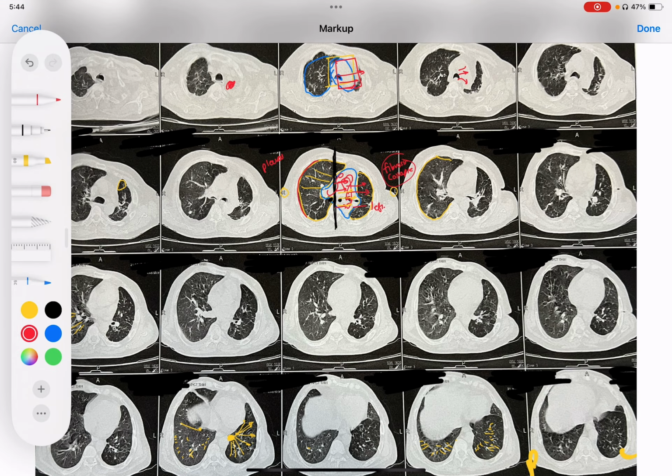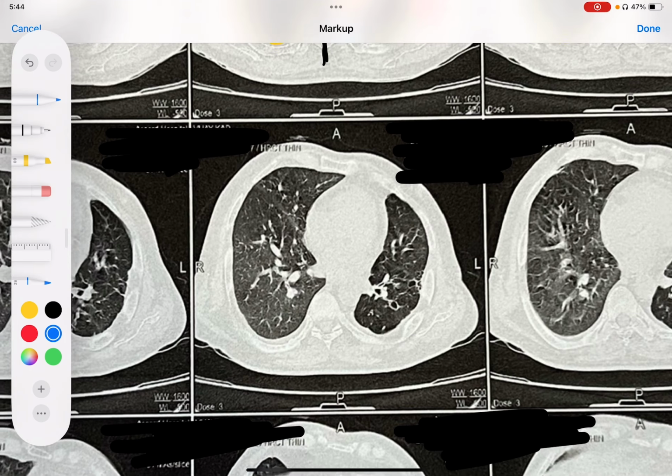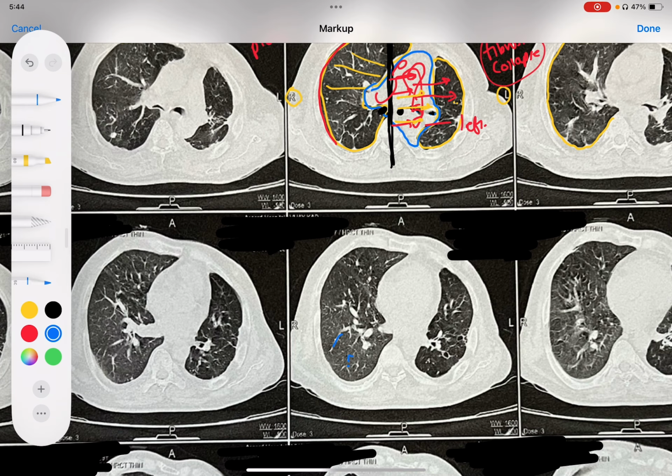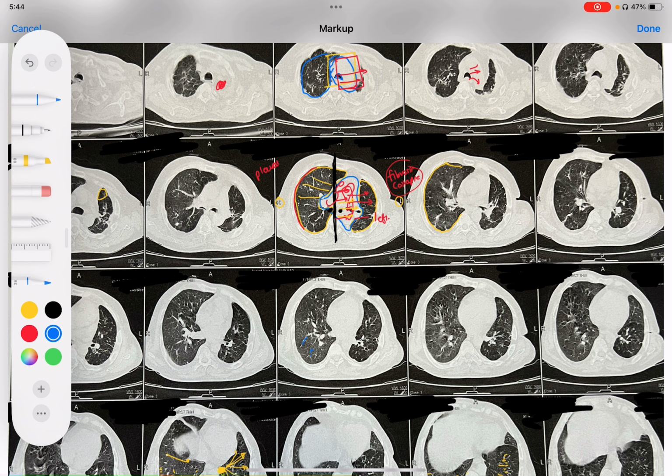So we can see that there are these dense white fibrotic bands which indicate that there is extensive lung parenchymal damage, which contributes to restrictive lung disease. There is left upper lung field fibrosis, most commonly because of TB, because this patient was retroviral disease positive, HIV positive, and had a history of tuberculosis, pneumonia that was bilateral, which caused extensive bilateral lung parenchymal damage.